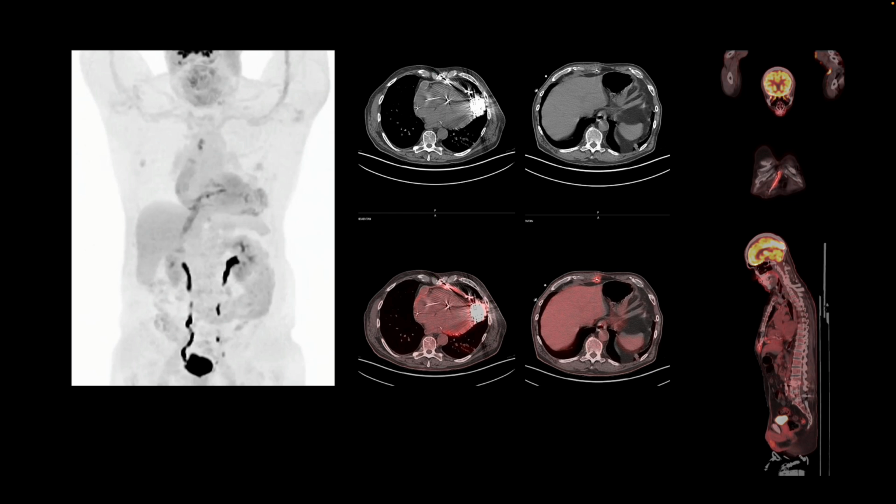The interesting finding about this study is that this patient has a left ventricular assist device. So we see part of it here, and we see this linear uptake along the driveline, and this is the site where the driveline is coming out of the patient. On the coronal fused image, we find that that's the driveline catheter, and there is soft tissue thickening and focal hypermetabolism around it, seen right there, and that suggests infection.